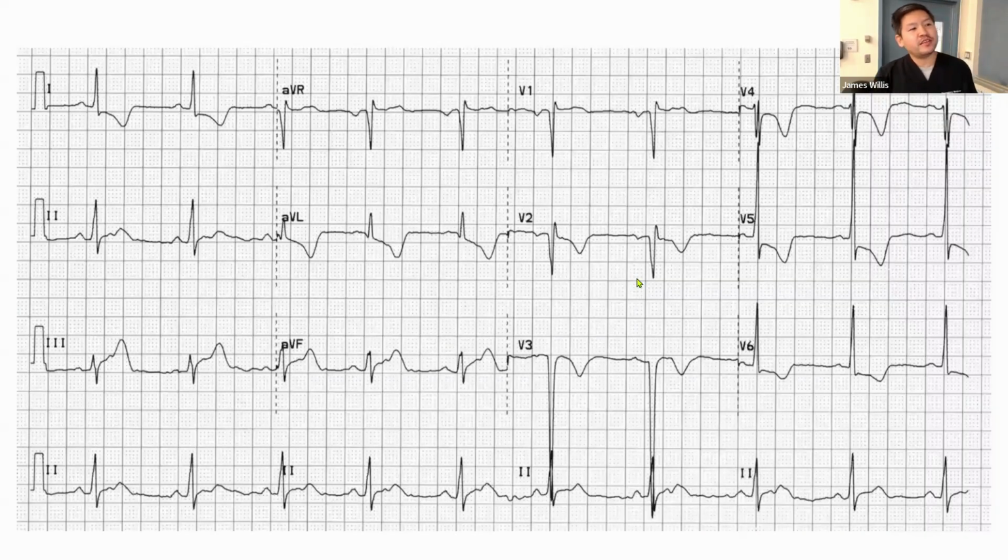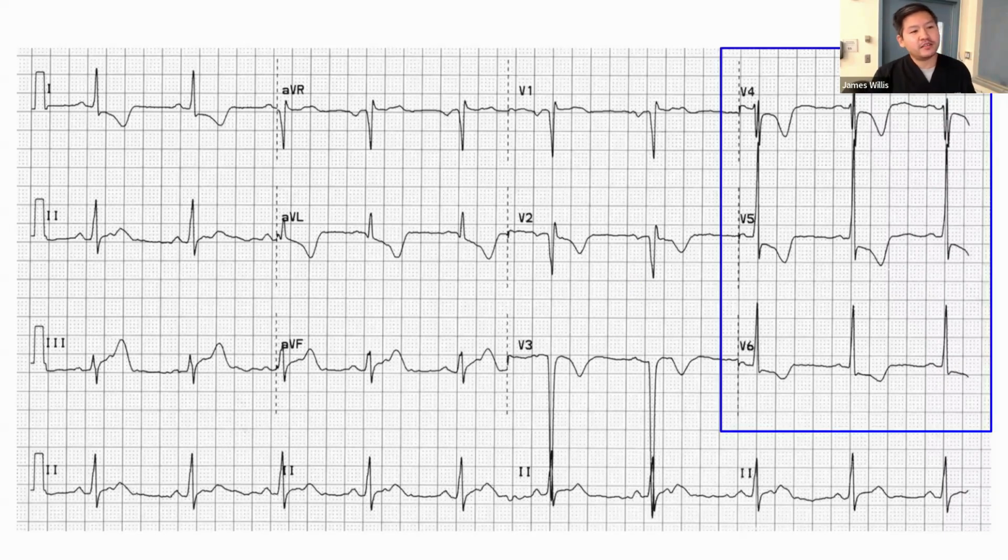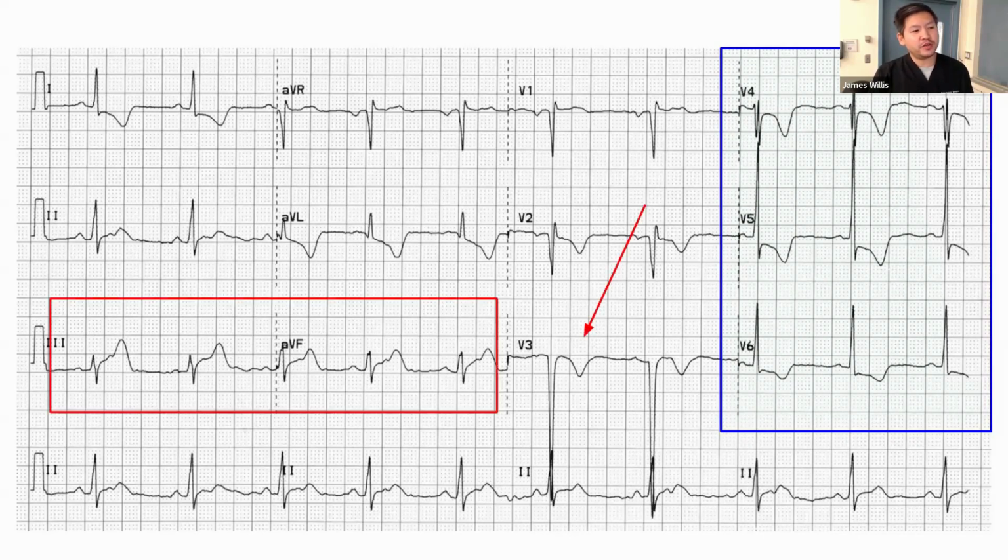Here's another example. If I was in a busy pod shift with 40 patients and I just looked at the lateral leads, maybe I'd just think this is LVH. But really you gotta look, this is your tallest, deepest S wave. There's not even ST elevation here, but your tallest ST elevations are in the inferior leads. So this is an inferior STEMI. So don't miss that. In this patient, you can have LVH strain and an inferior STEMI. You can have them together. That's the beauty of emergency medicine.